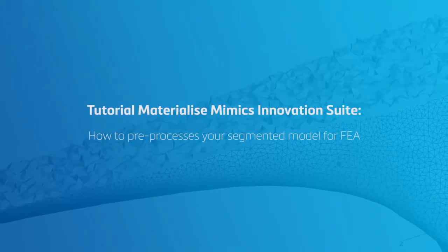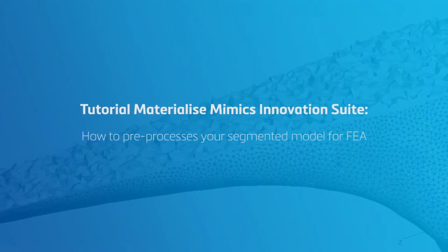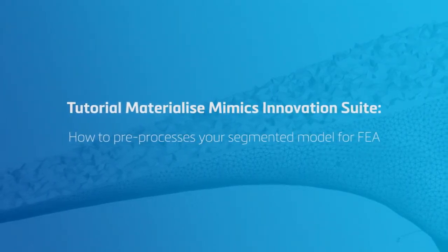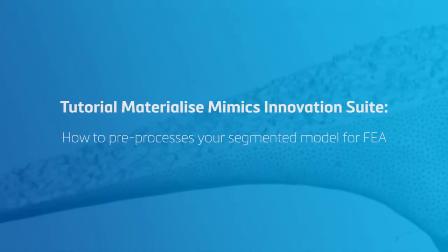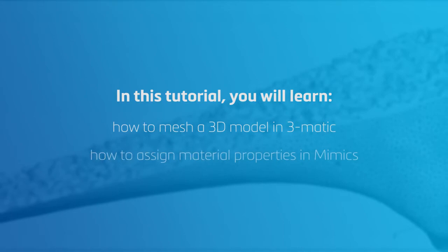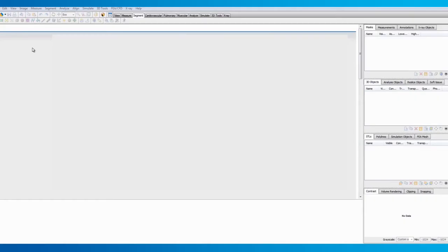In this video, we will show a typical workflow in the Materialise Mimics Innovation Suite, going from segmented medical images to a model that is pre-processed for finite element analysis. You will learn how to mesh a 3D model in 3-matic and assign its material properties in Mimics.